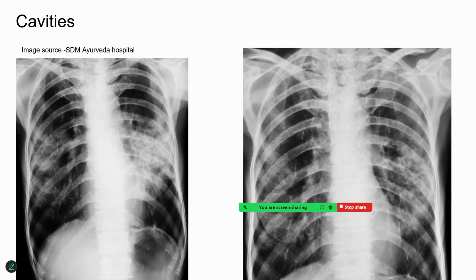Cavities in the lungs could also be produced due to other lesions, other causes also, and it's important to differentiate these as far as possible. Though the differentiation based upon the X-ray may not be absolutely accurate, and there is a need for other investigations too, to a great extent we can make out the difference between cavities produced due to tuberculosis and other lesions. Typically, a tubercular cavity would have a smooth surface inside.